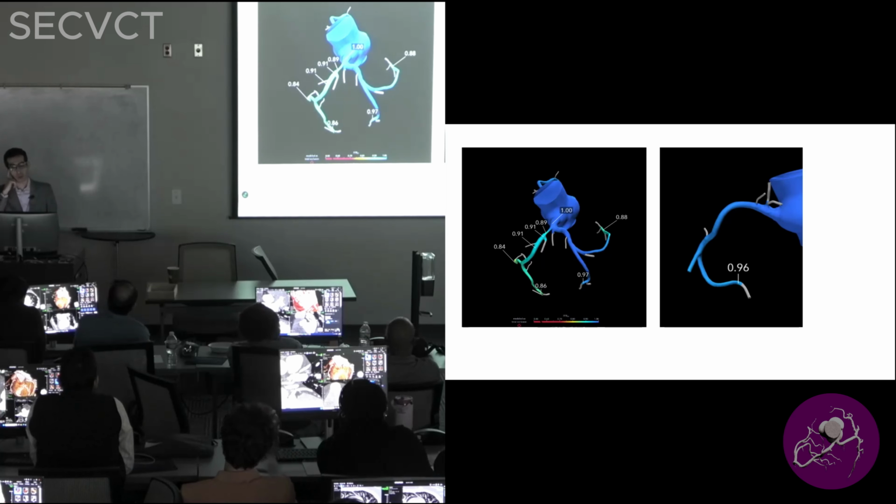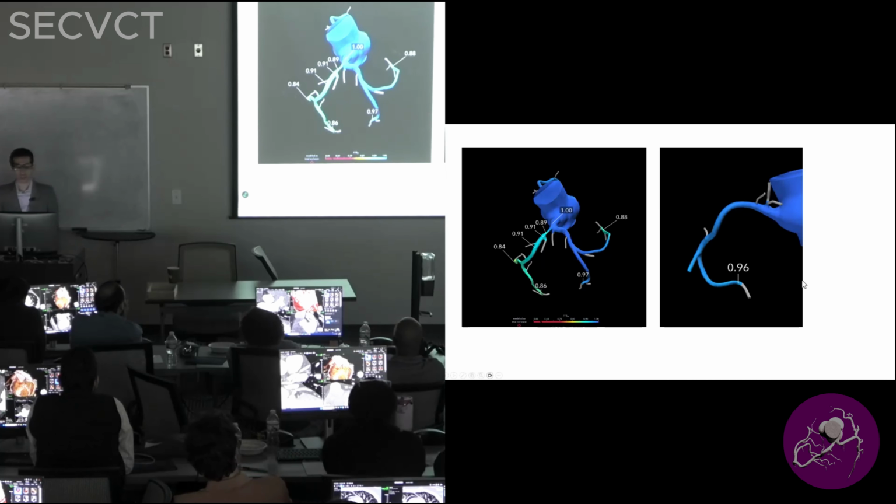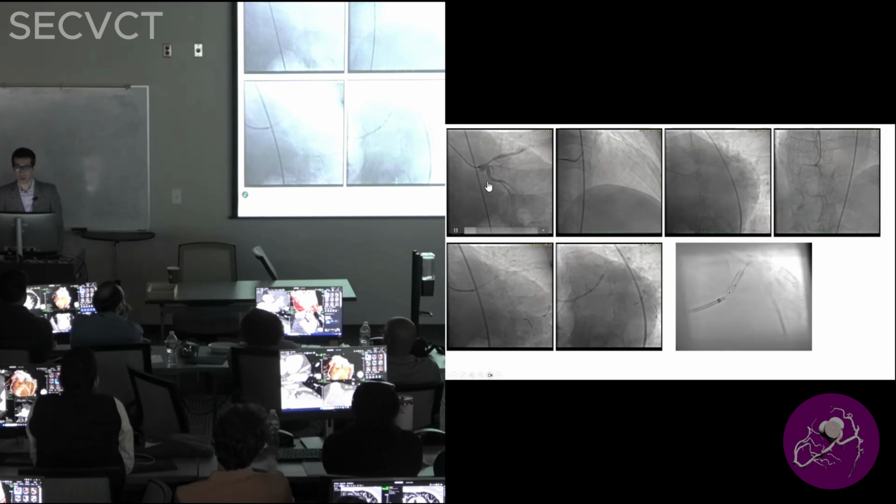So when I believe the anatomical data is going with severe, and there's something here, I don't stop here. So I called the cardiologist and I said, tell me how symptomatic is this patient? They're like, yeah, symptomatic, family history. I'm like, you need to proceed with heart cath. So this is just a story to point out to you that CT-FFR can be good, but here's the angiogram.